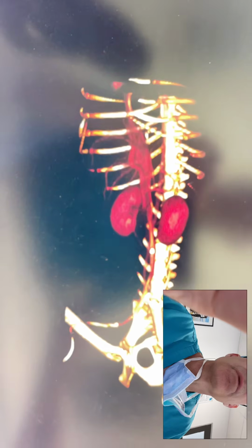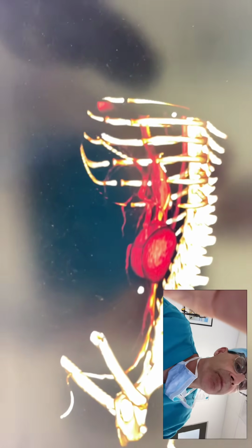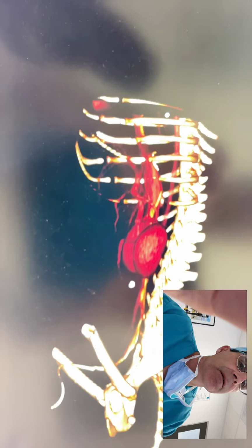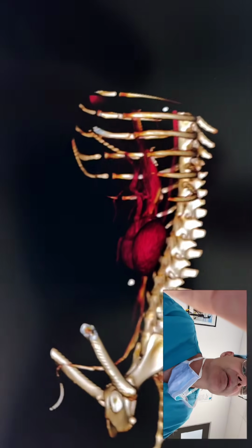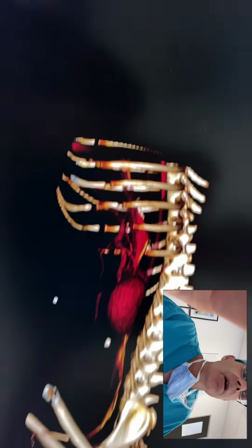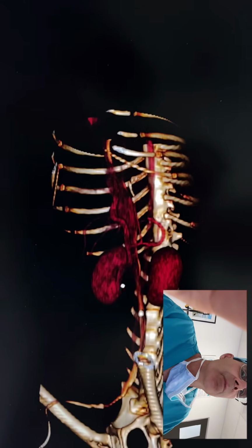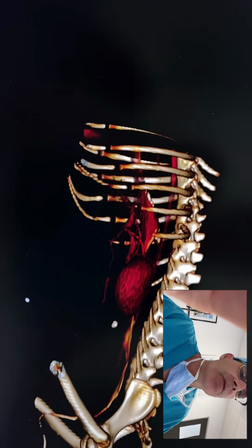Let me just change my windowing a little bit. Okay, so again, as we're looking, we see no evidence that those two vessels are touching in any way. Let's just see if I can reduce the brightness a little bit. That's a bit better there. All right, so again, looking, we've got the portal vein right there and the vena cava right there, and we look around, we don't see any evidence that those two structures are meeting. So anyway, that is a normal abdominal CT scan with no evidence of a portosystemic shunt.